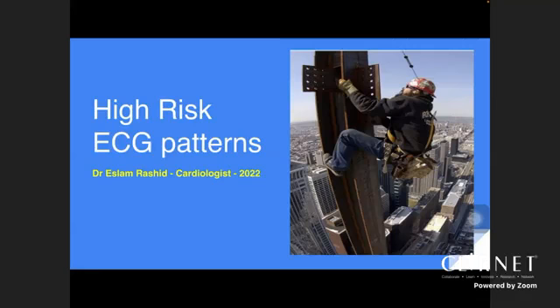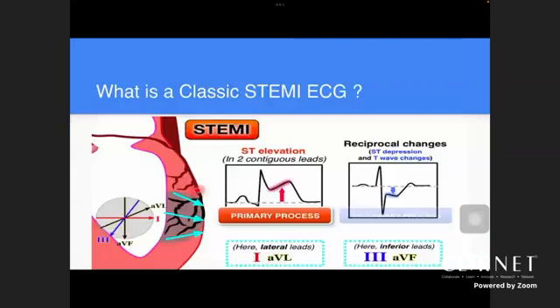is as equally important as STEMI itself. So let's start with these high-risk ECGs, which I think everybody should have at least an idea about. This will help identification of more and more patients at risk. So what's a classic STEMI ECG?